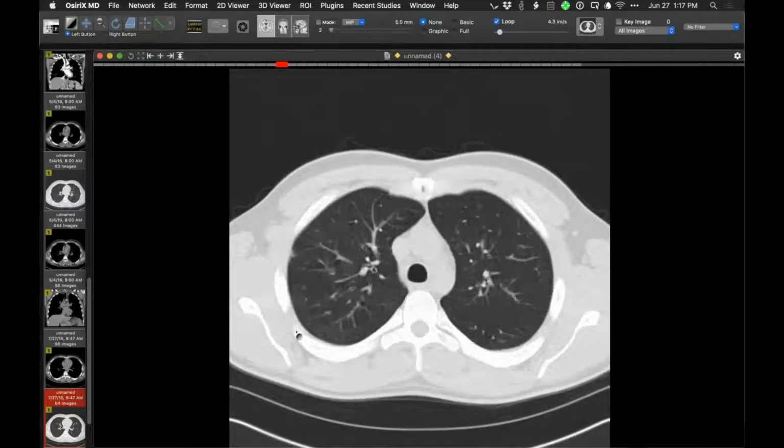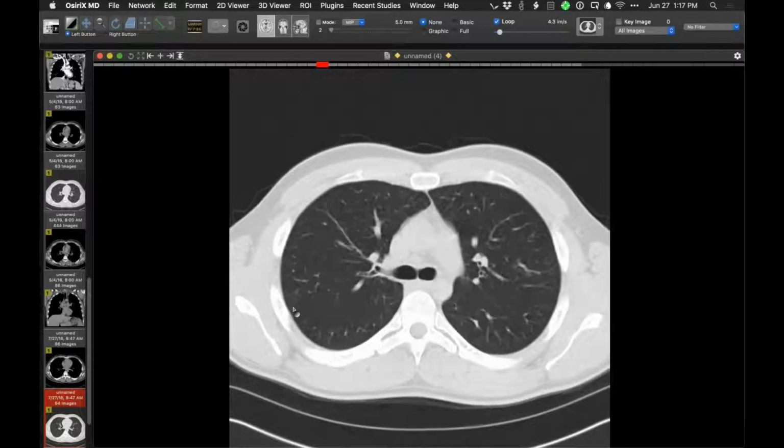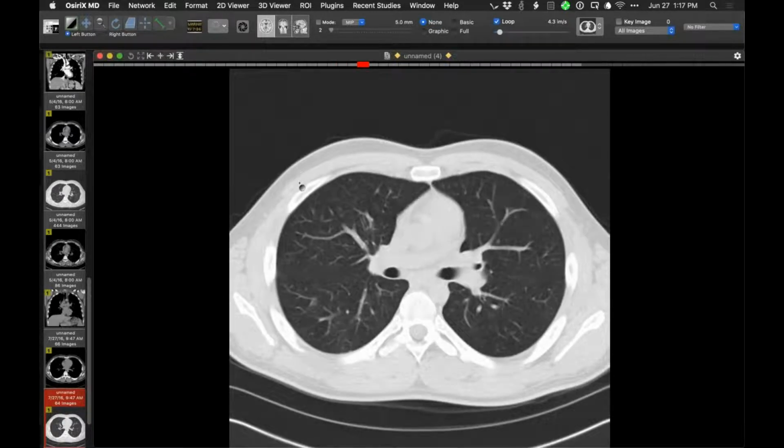And when the lesions are large, the clinicians get nervous. I think this is a nice example, presumed, of spontaneous waning of lesions of GL-ILD here in just about 2 months or so, just over 2 months.